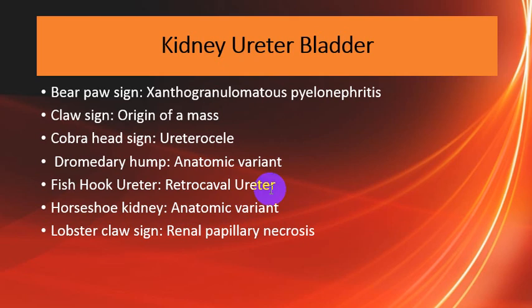The kidney, ureter, and bladder signs: there are multiple signs.